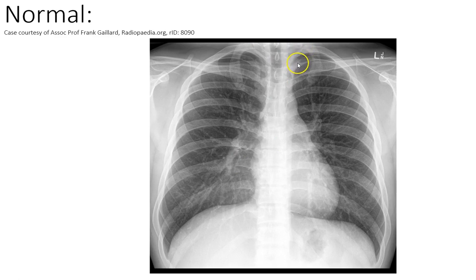Know that there are both ways. So 1, 2, 3, 4, 5, 7, 8, 9, 10, 11. I think that's probably more accurate. But you can see at the top here, it's really hard to count them and very easy to miss one. And when you get your eye in, and you get used to looking, I just find this a much easier way of counting down, and more reliable for me.